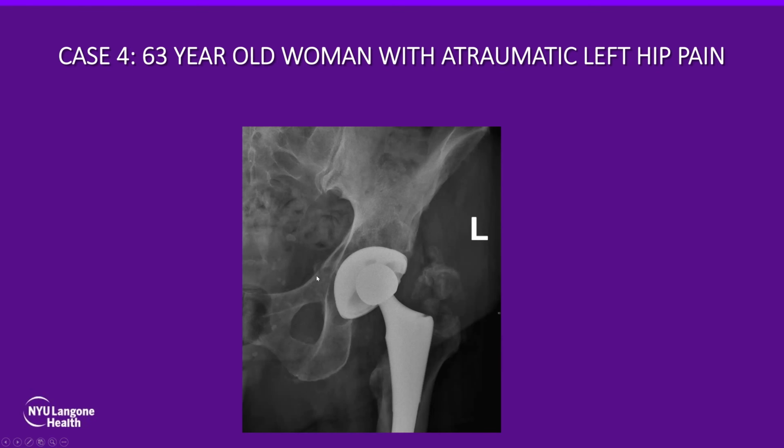Again, I look at the middle acetabulum. We see that there is this lucency here. The osteolysis is not just here. It goes all the way medially. And at this point, we have almost disruption or destruction of the cortex. So putting these findings together, this was a case of synovitis secondary to polyethylene debris, also known as particle disease.